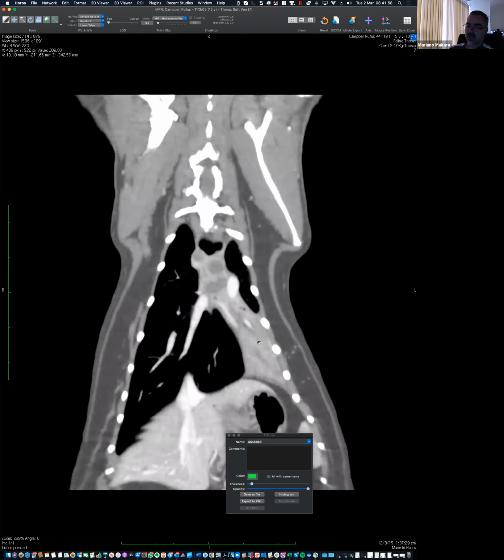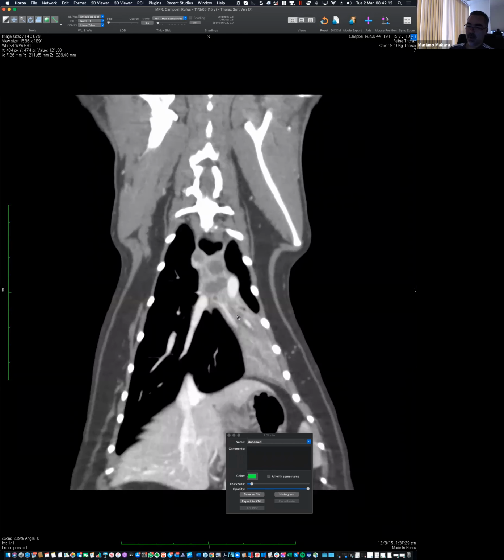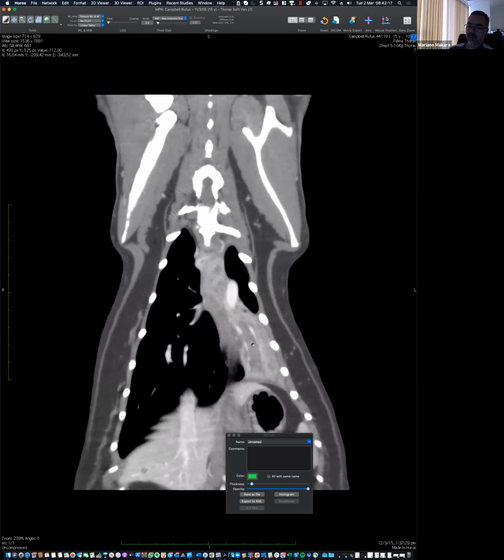So this lung, basically, this is the pulmonary vein, this is the pulmonary artery. To this left caudal lung lobe, which is soft tissue, like in our case. And this is going to be the airway in between the vessels. And the airway is all replaced by a soft tissue material. Make sense? So artery, vein, airway.